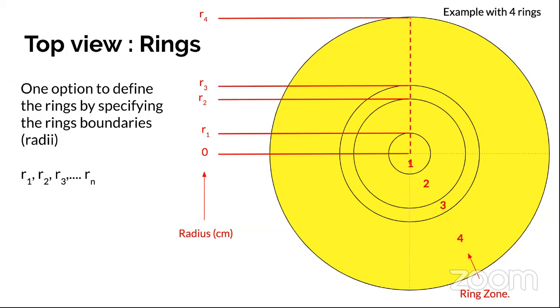You could select something smaller, that's fine. And then we wanted another outer ring that is at 15 centimeters, just so that it provides the scattering and so on. We were not interested in recording anything in, let's say, ring number 3 or 2 and so on. So in that particular assignment, 2 rings were sufficient. One to define the central axis cylinder, and one to define a large outer ring, just so that it provides the necessary scattering. Okay, so far so good.